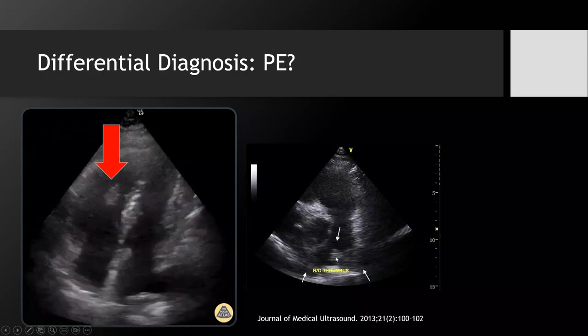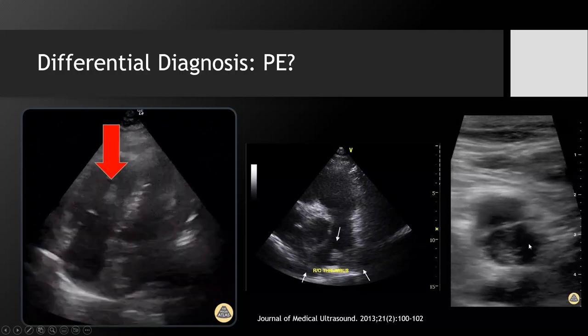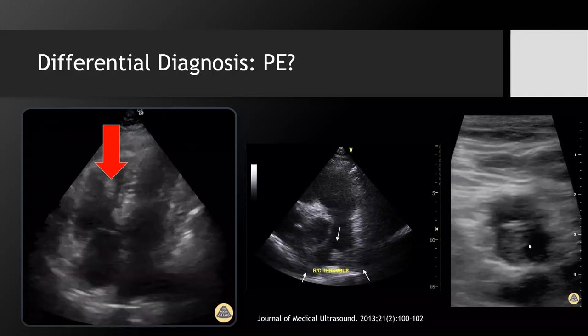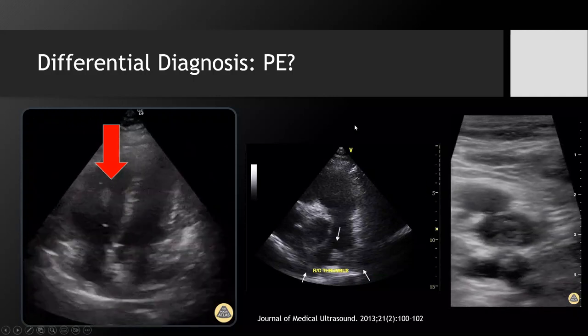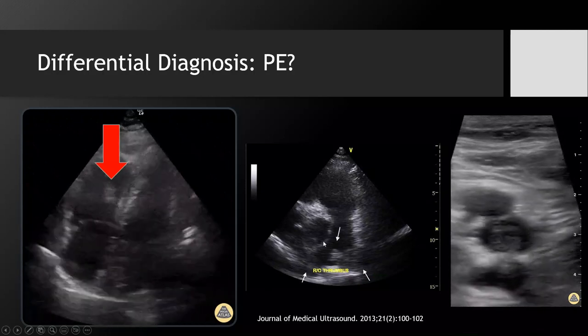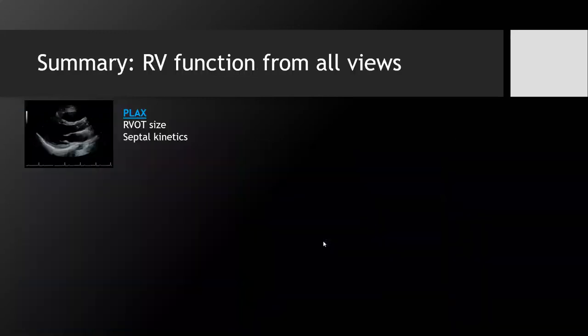Maybe you're not able to see anything on the echo, but you're savvy with vascular imaging and you're able to see that there's a significant DVT. And maybe it is old, maybe it's new, but regardless, it will help guide whether or not you want to anticoagulate this patient. So there are other ways that your comprehensive echo and critical care ultrasound skills are going to inform your interpretation, perhaps even of just an echo in an acutely decompensating patient.